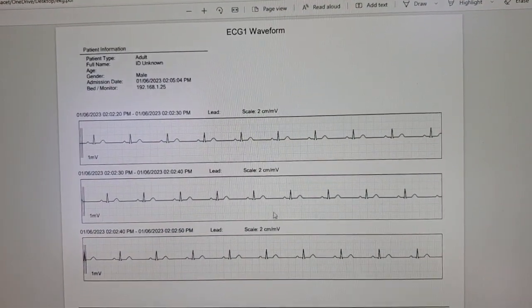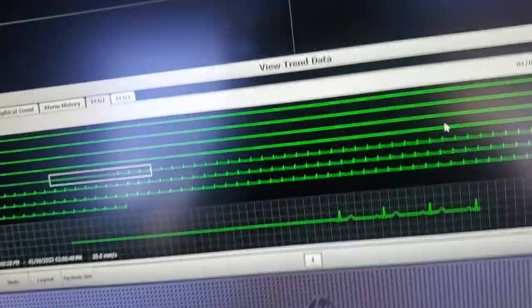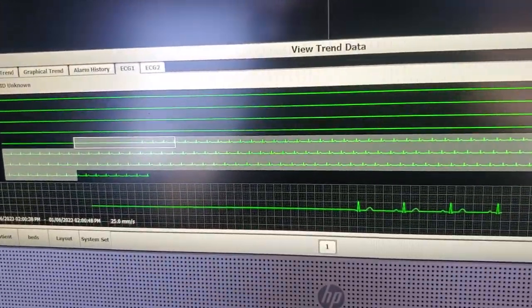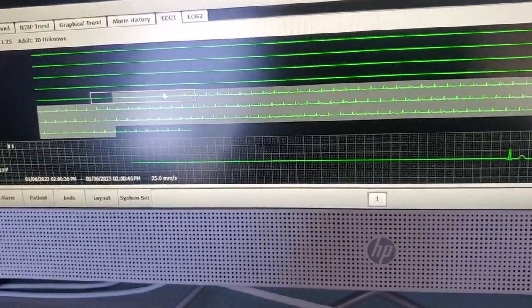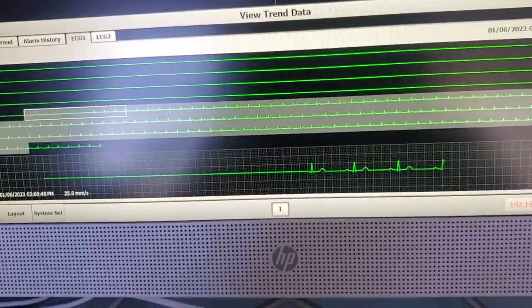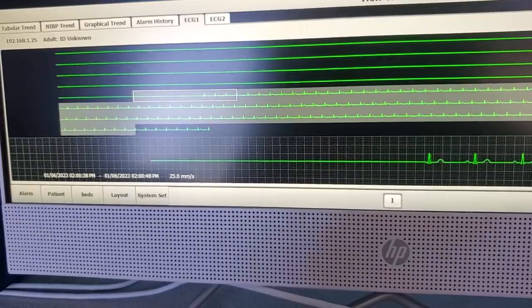Now you're probably going to want to play around with this a little bit until you get the sections properly, because I know that the gray section, oh, okay, I see. You're going to want to choose the selection that you want to start, hit clear, and then select. Okay, that works.